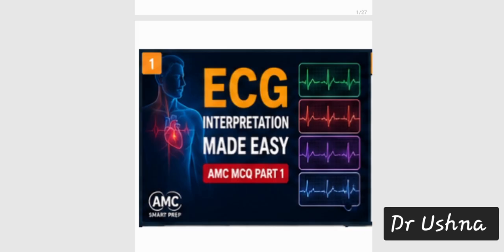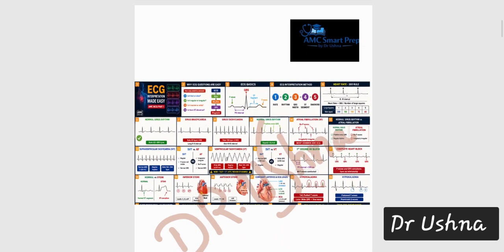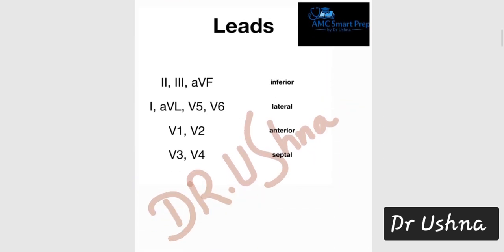ECG interpretation is a very high-yield area of the AMC exam, and many students struggle to interpret the ECG correctly. So let's begin. What is basically ECG? Okay, so the introduction of the ECG. First of all, you should have an idea about the leads of the ECG. Before rushing towards ECG interpretation, one very important piece of information is the leads.